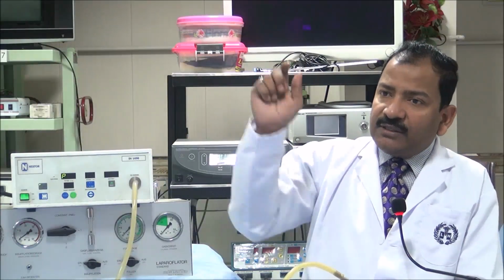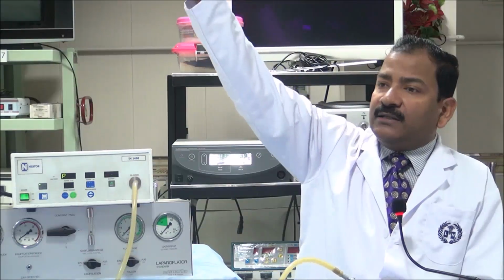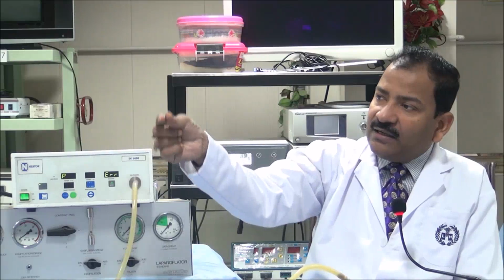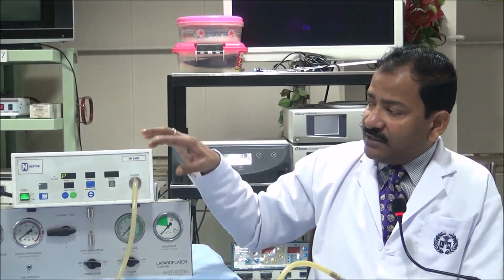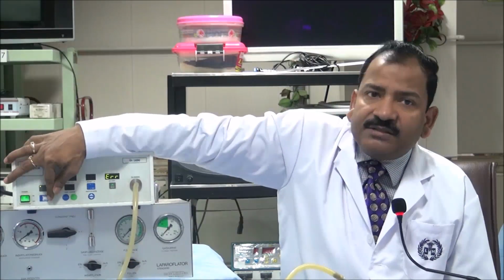How is she doing it? First she attaches the IV tubing to the bottle and brings all the saline up to the tip, and then she connects to the cannula so that no bubble goes into the vein. Exactly the same way, this insufflator has recognized that this is a wrong method of connecting the Veress needle, and that's why it is giving the error and all the buttons are locked.